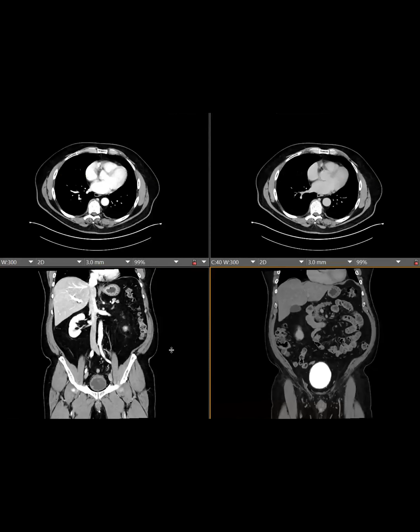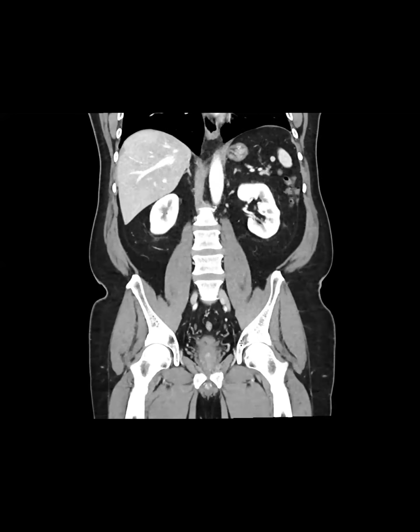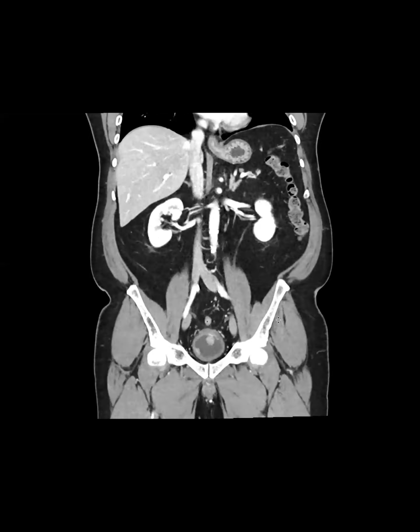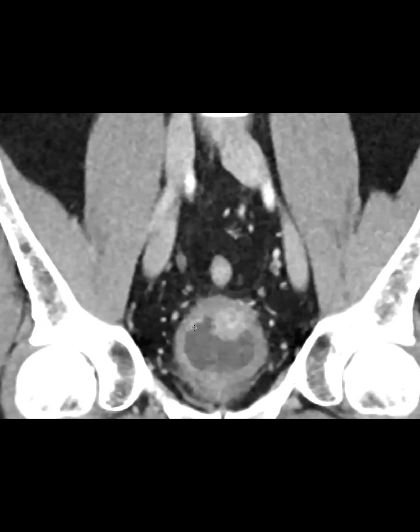So, I wanted to reiterate how valuable the nephrographic phase is. This is a little early nephrographic, but to look for ureteral enhancement. And I find that it's very helpful for the bladder, for CIS, for example, right? Some of these flat lesions, for example, I see them best on the nephrographic phase, the venous phase.